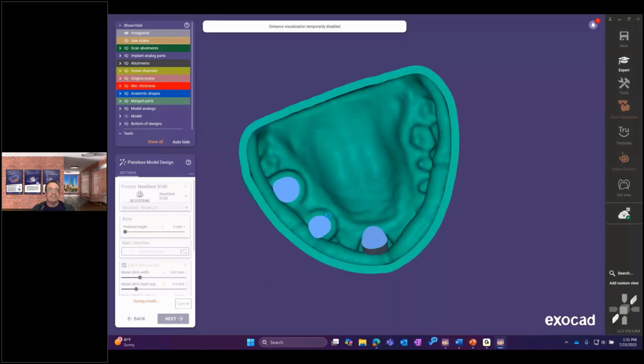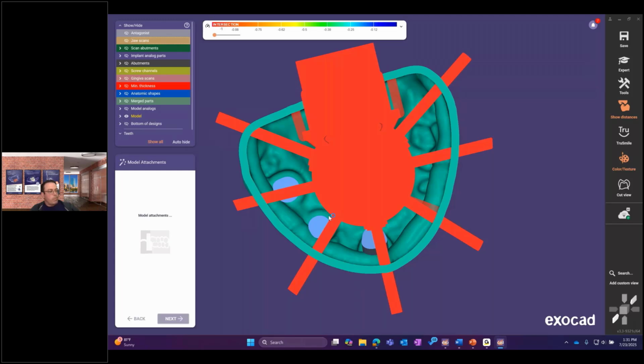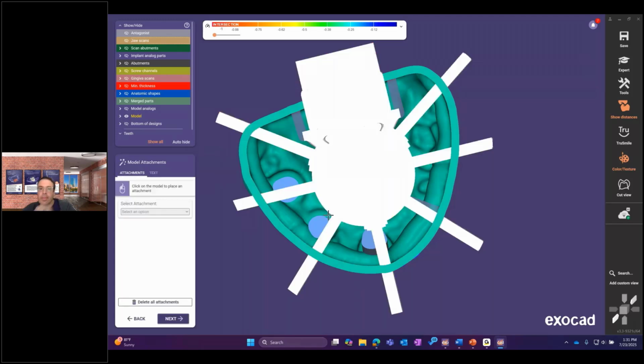Oh, nice. Okay, cool. One of the questions that I think is applicable and good to understand: the default model type, you can change that in DentalCAD app while you have the software open. You go to your tools, settings, add-on modules, and then within the model creator section, you can select a default model type for that.